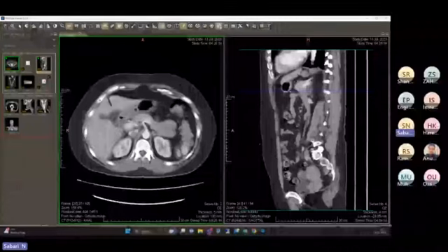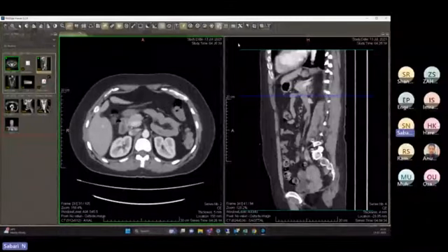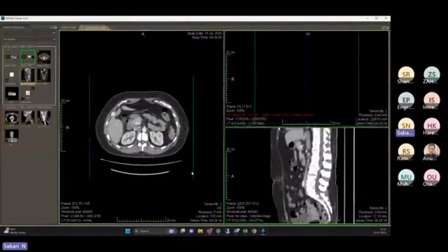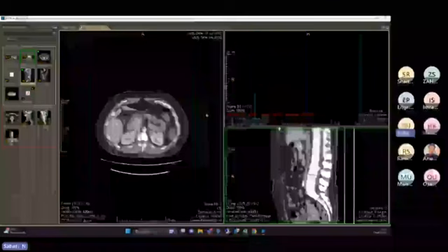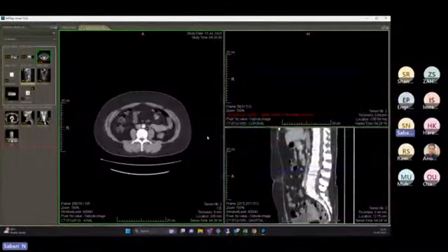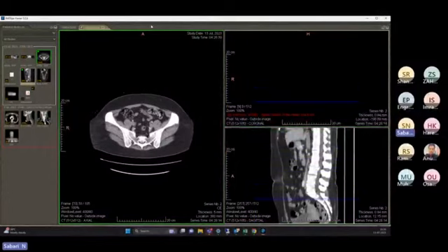And they want to go to the next series, yes, they can go to the next. The next one is called MPR. MPR stands for multiplanar reconstruction, because the scan has been done in the axial series, so I can convert it into three different views, like axial, sagittal and coronal. So the radiologist can view this in the different planes. This is called multiplanar reconstruction.